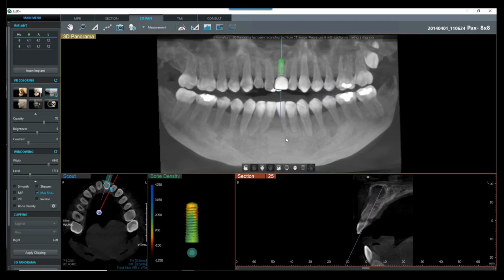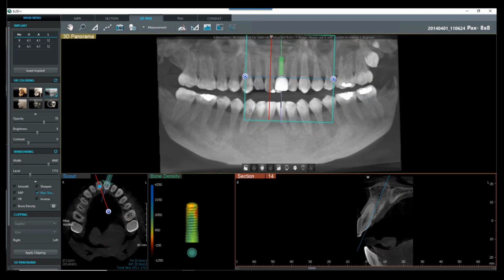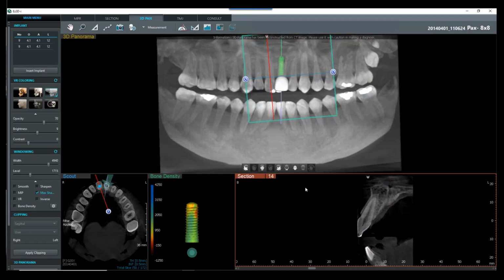Okay, so anything you want to add, Jim? Yeah, let's talk about one more thing over here. Another quick way to place an implant. Let's go over here to number 8 really quick. We get this question a lot, and I use this for patient education.